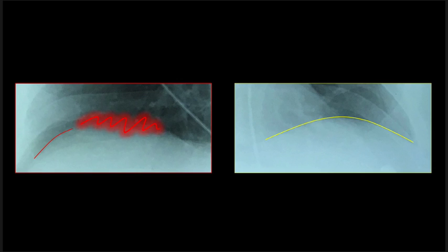And you may say, well, that's because I'm applying the silhouette sign and there's obscuration of that diaphragm, it's blurred. I think there's something there. Well, this is an off-angle artifact. And so you have to be careful when you're interpreting radiographs that were performed at the bedside, especially when they're supine. And this can happen on either hemidiaphragm.